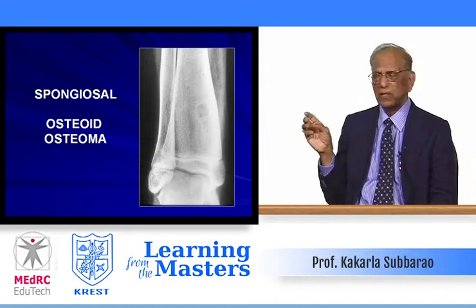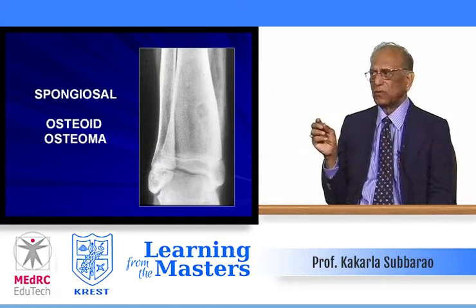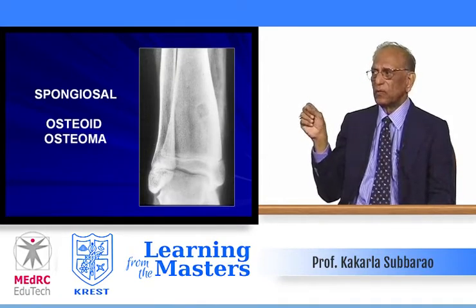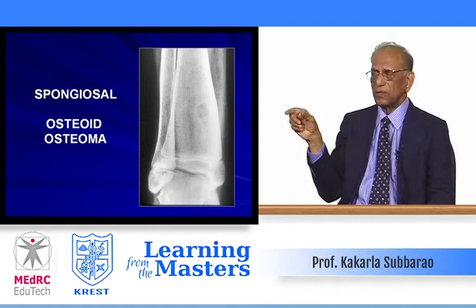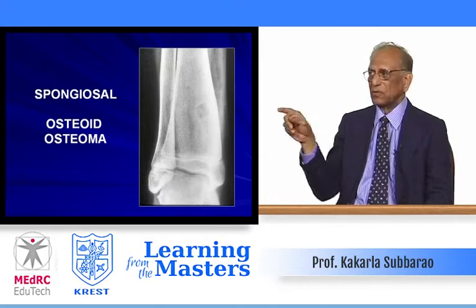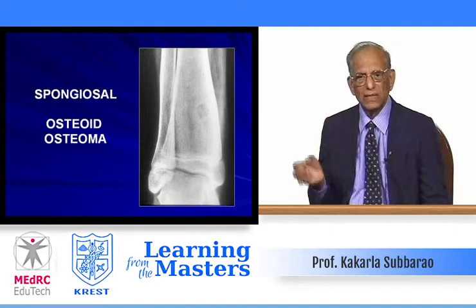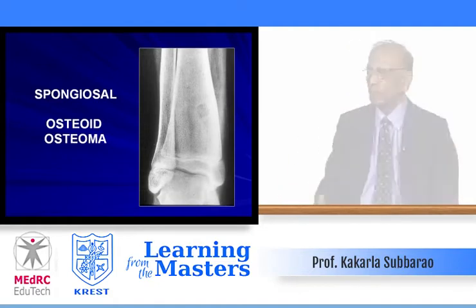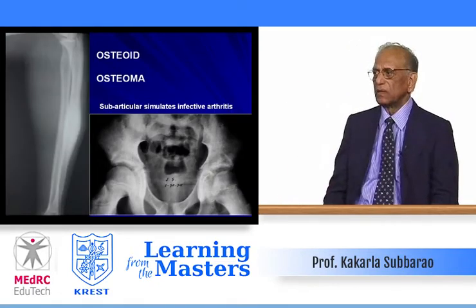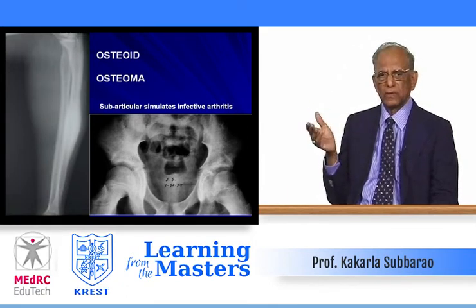It is painful. Occasionally, insignificant cysts can occur in long bones or flat bones. But here, if you look carefully, the metaphysis is widened, because most of the osteoid osteomas are hypervascular. Of course, this is osteoid osteoma. This is not much of a nidus, but if you take CT, there may be some bone debris. Again, in the midshaft of the ulna, osteoid osteoma producing diffuse sclerosis.